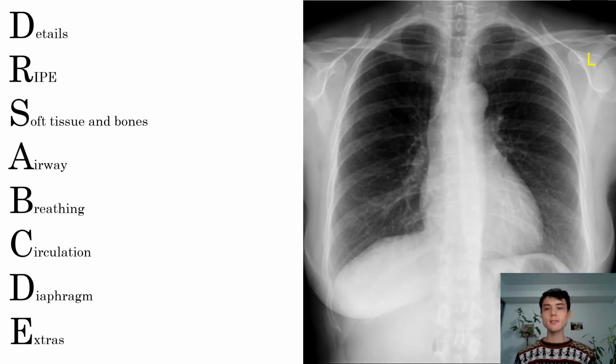Have a look at this chest x-ray. This is a normal chest x-ray, but I think it's very helpful to have some kind of pro forma to avoid missing things when we interpret chest x-rays. So one that I find really helpful is Doctor's ABCDE, which has been popularized by Life in the Fast Lane.